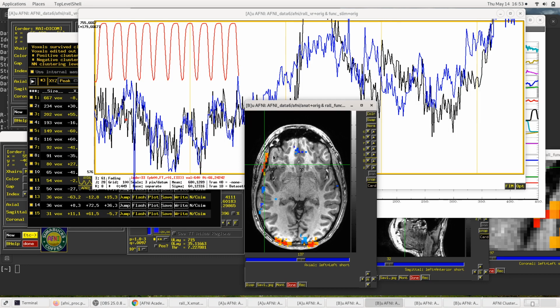If we blur this and it goes into the data set, then if the data's been masked, you may end up trying to explain this somehow as a bold effect, even though it is not, and that's terrible. That's certainly not something you would want to try to put in a paper.